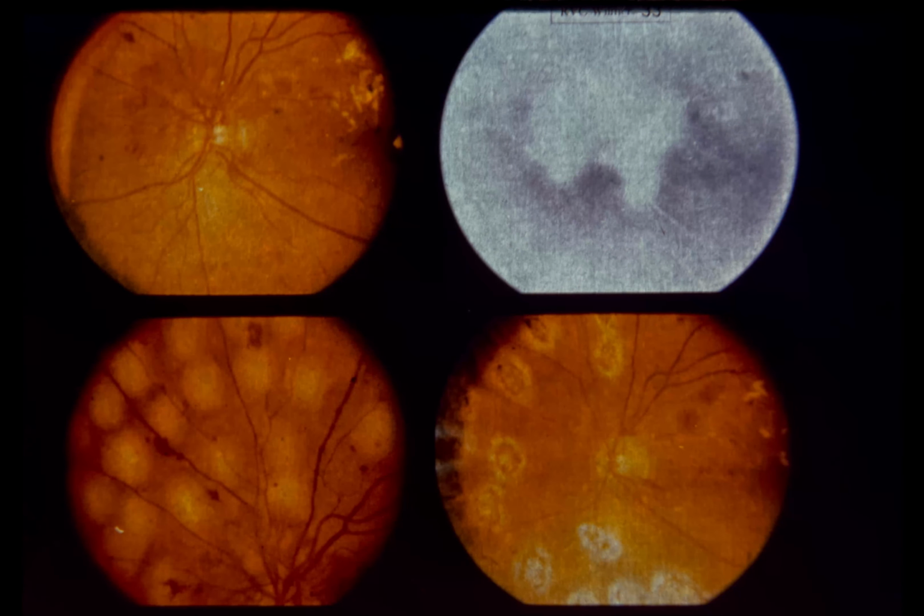Slide 33. Scatter xenon arc photocoagulation for disc neovascularization. This 67-year-old white female has had diabetes for 35 years. Visual acuity left eye was reduced to 20/40 because of macular lipid. Upper left, note extensive surface and intravitreal disc neovascularization.